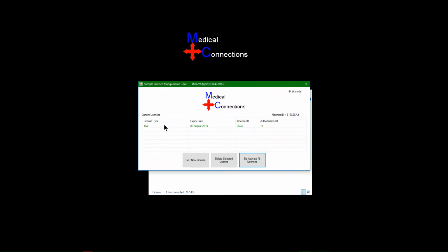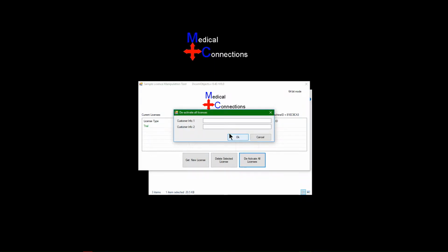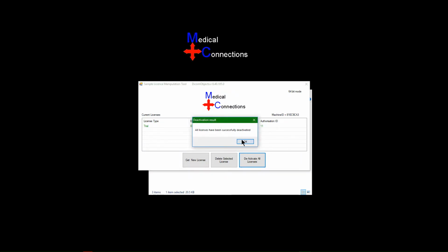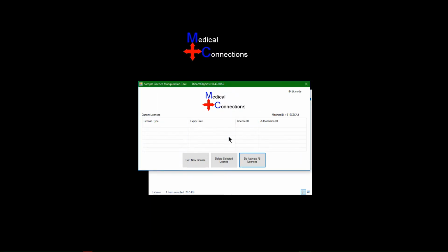As you can see, I have a full trial license available to me, and I'm going to deactivate that license. I'm going to add licensee name, that'll be your customer name, and the customer's name or site name. And as you see, it took a couple of seconds, but we have all licenses deactivated.